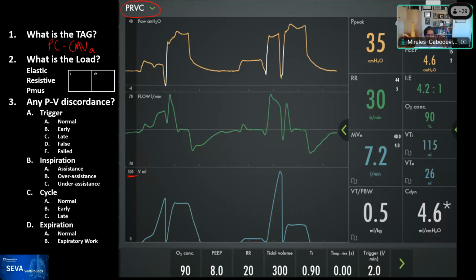So that's the targeting scheme, and this is very important because now you know, because you're controlling pressure, you should come and see the flow, even though you may not want to look at the flow because it looks horrendous. You're controlling the pressure, so you look at the flow. The breaths, because they are mandatory ventilation, should all have an inspiratory time of 0.9 seconds, and it's adaptive. So the pressure may vary, but the ventilator is going to try to hit the target tidal volume that you have for this patient.